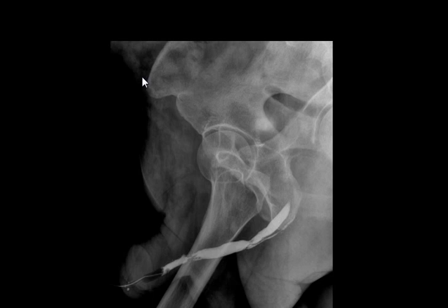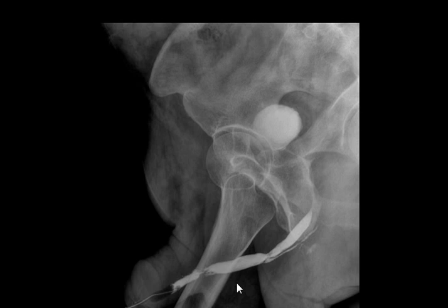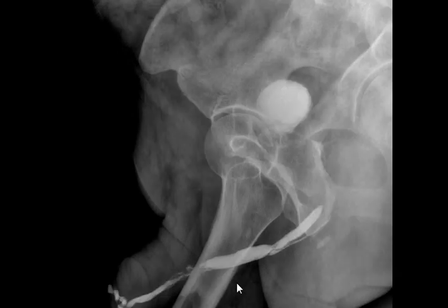You see there is a gap. You have 4 images; why do you see only one and judge? Can you see the rest of the images? Here there is a urethral injury. Describe what your report will be for this case.